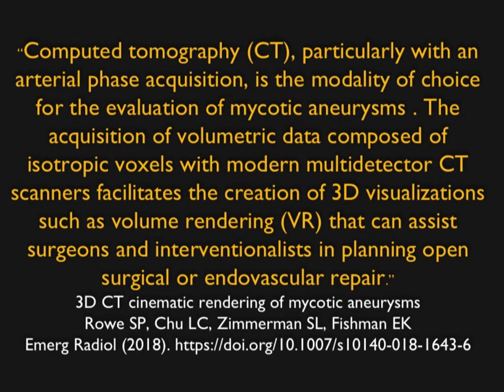Again, you want to be very careful in making that diagnosis. The patient commonly, when they do have dissections post-trauma, will occur in the ductus zone, but you don't want to overcall that. You want to be very careful, and the cinematic rendering can help you do that.